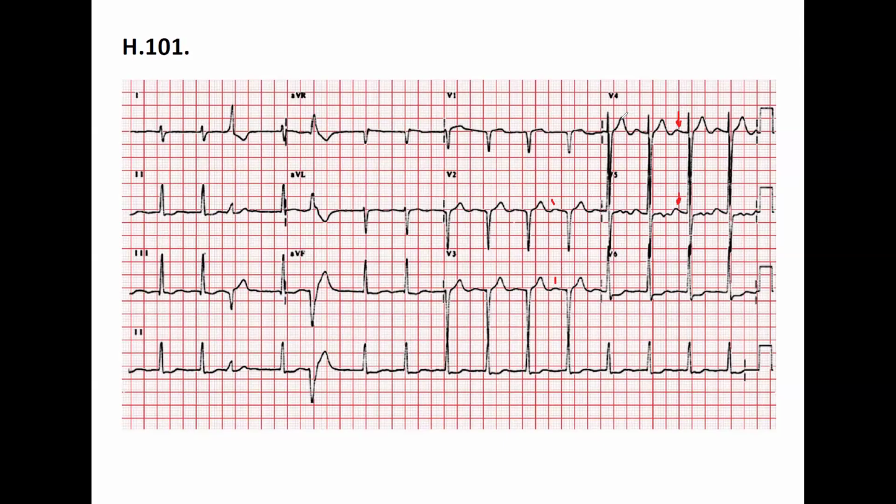And I would say that could be a sinus rhythm because this is rhythmic. If you had complete arrhythmia, you could say that's atrial fibrillation, but this is not, because it's rhythmic.